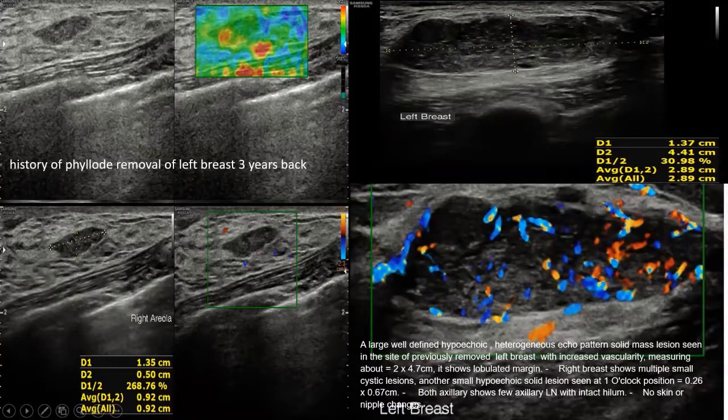If you look here, this is soft, the red is soft, and then the green, and the yellow after the red. The softest is red, less soft is yellow, and hard is blue, and the green is in between, but toward the stiff part of the lesions.